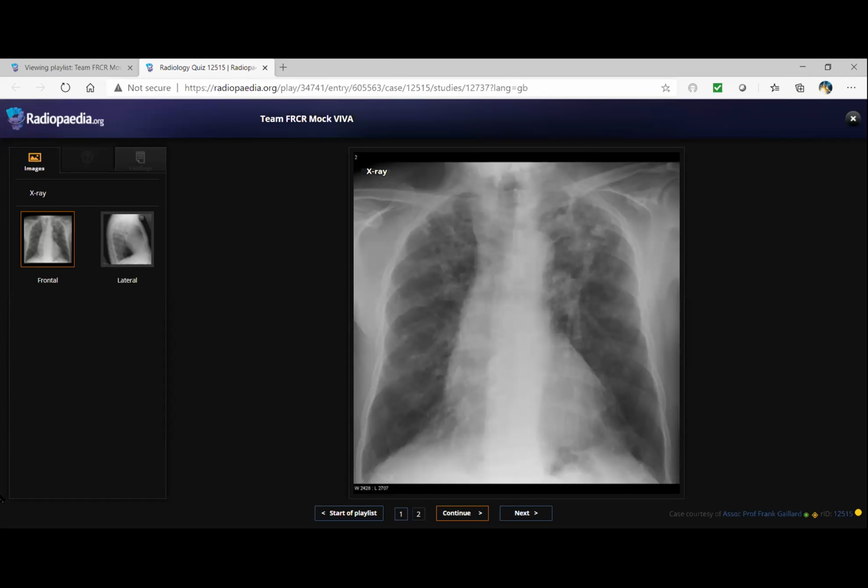If this patient had been to any endemic areas of TB and had previous TB, it would look like that. Or if there is an occupational exposure to sand or something similar, it can be due to chronic silicosis. But I'm not seeing any dense nodular opacities. This patient needs further evaluation with a CT chest, comparison with the previous images, and also correlation with the clinical history.